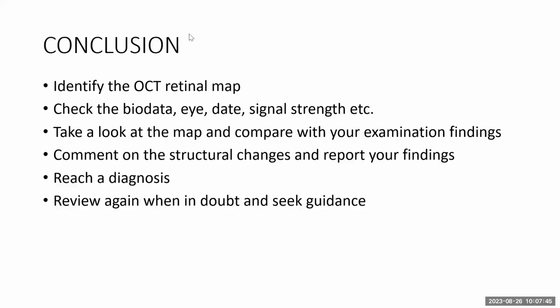Also, if the patient is someone you've been following up for a while, your OCT will show you when you have drusen in the patient, and you repeat your scan, you see that the drusen is getting bigger. When they coalesce, you see that dome, but it's much more hyper-reflective. But when it is hemorrhagic, it's usually bigger. The hemorrhagic PED is usually larger and is hyporeflective. So that's a clue to differentiate the two.